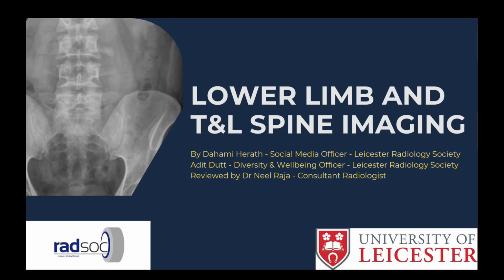Okay. So to start off with, how do we interpret a musculoskeletal X-ray? So the number one thing that we always have to do and never forget is to confirm patient details. So you need to check their patient name, date of birth, and NHS number. Then we need to look into the film details, so the date and time the film was taken and what area of the body was scanned. Then we can go into adequacy of the film. Usually you would require a minimum of 2 projections, and ideally you should have the joints above and below also imaged, and you would also look into rotation and penetration.